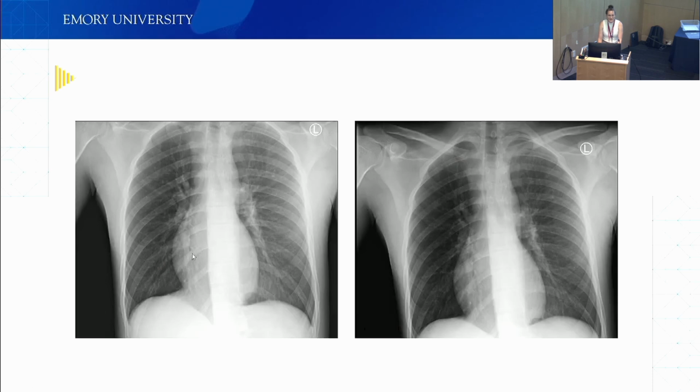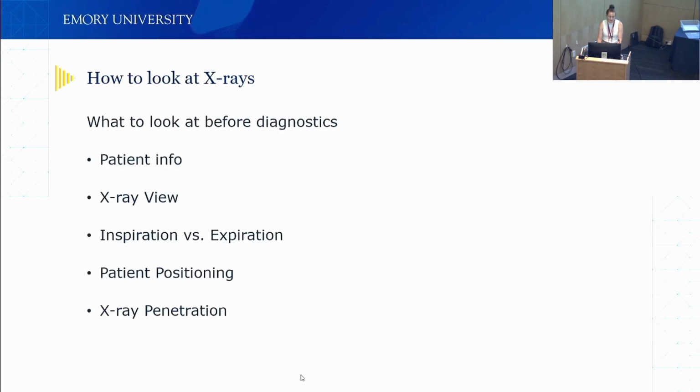Sometimes they do multiple X-rays because here the top is missing. They do a second one. You see a little bit of the bottom missing. So most radiologists would read both to get total information. Again, if you want to use AI, you have to give it both, or you have to accept that you're missing part of the lungs.